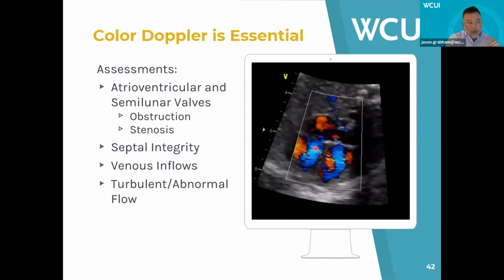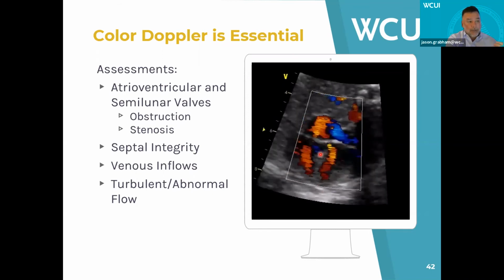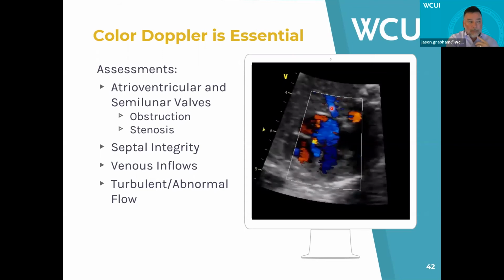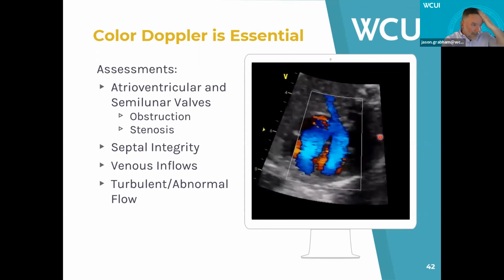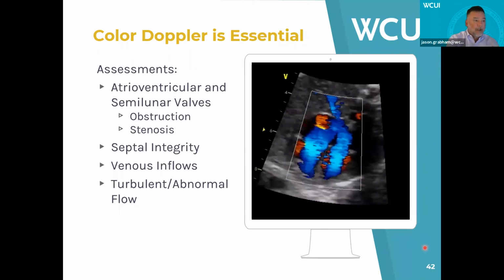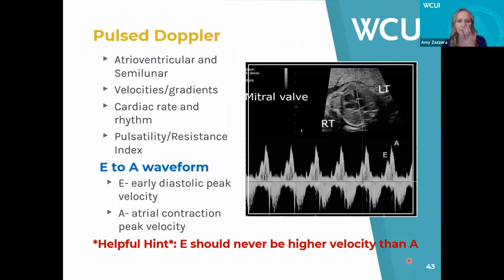But we're focused on this. Your interpreting physician might be looking at the ventricular septum, and they might see a little apical muscular VSD, or they might say, hey, look at this right pulmonary vein, beautifully demonstrated flowing into the left atrium. So that's the value in the cine loop: you get a lot of different ancillary information, even if you're not looking specifically at that point of interest. And like you said before too, it just gives another set of eyes a chance to look.